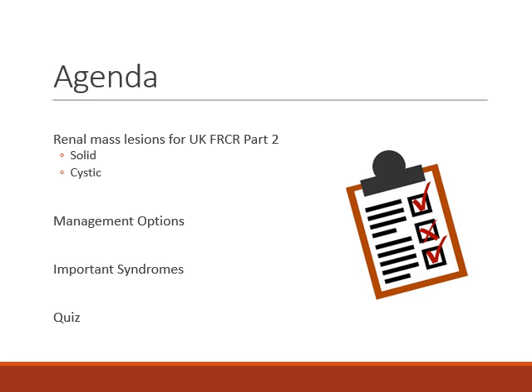We're going to cover solid and cystic mass lesions, the important associated syndromes, and end with a short quiz to test everything that you've learnt.